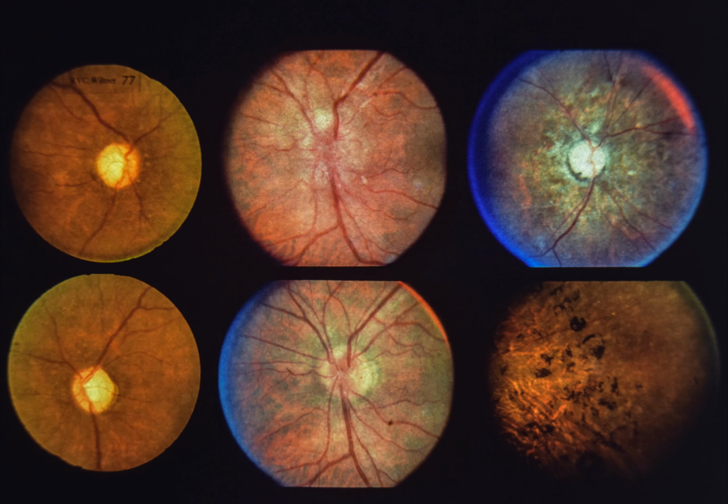Spinal fluid pressure is normal, but there is often a pleocytosis. Prompt treatment with antibiotics generally results in resolution of optic disc edema with preservation of normal visual acuity and fields. Upper right. This 70-year-old male with documented neurosyphilis had no light perception in the right eye. Note the pale atrophic disc, narrow retinal vessels, and extensive peripapillary pigmentary change.